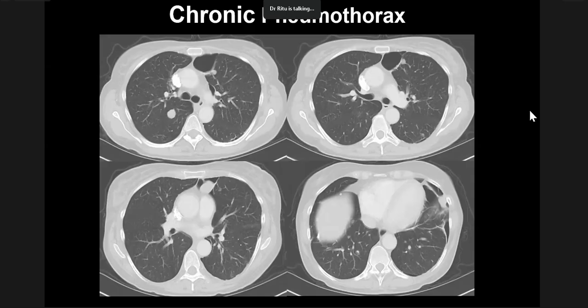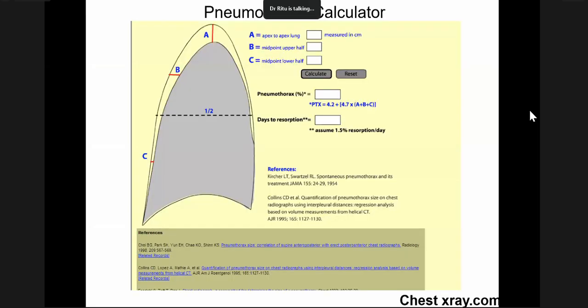However, it doesn't really even increase. So it remains pretty stable, and sometimes people will mislabel these as emphysematous blebs or cysts. This is a pneumothorax calculator which I got from the web.